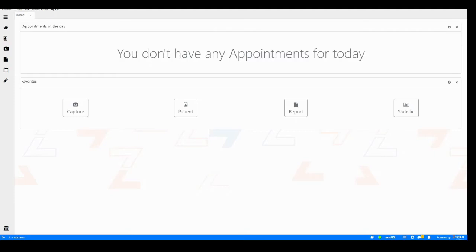Hello, welcome to one more video about how to use ZSCAN EVO. Today I'm going to show you how to customize your report templates. First, I want to show you one very important thing about ZSCAN EVO.